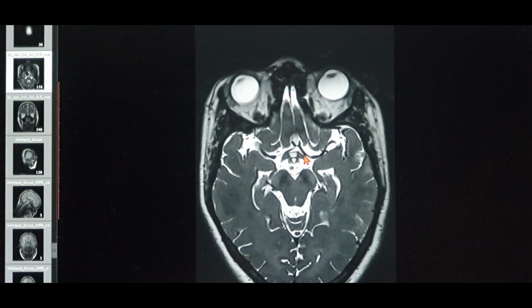Normally a radiologist gives you a superimposed radiological scan wherein, once the contrast is injected into the bloodstream, it takes some time to go into the blood vessels and into the brain. A professional radiologist can give you an idea of the exact time, but it's within a few seconds to minutes. So once you get a T2 scan, or a T1 post-contrast scan, normally the veins in the MRI scan fill up.